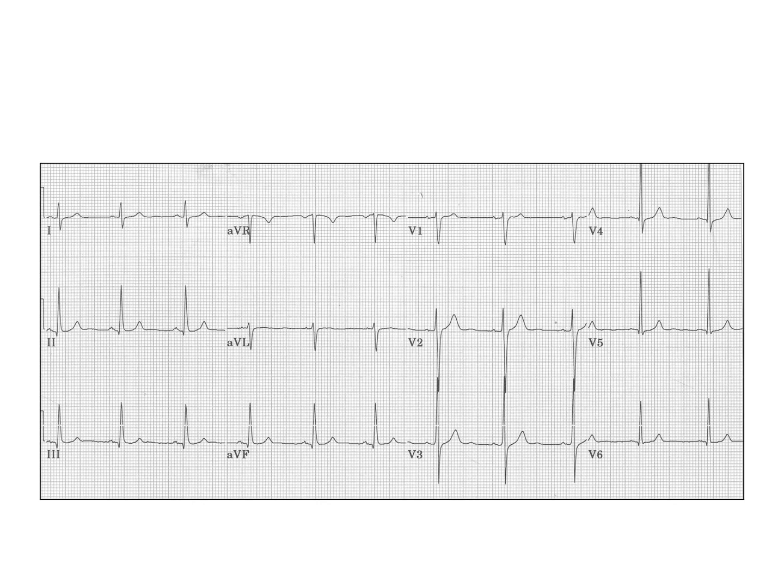There is very little difference in the amount of positive deflection between leads 2, 3, and AVF, which means the electricity is going pretty much straight down, which is a little bit more rightwards than in an average heart, but it's still in the realm of a normal axis.